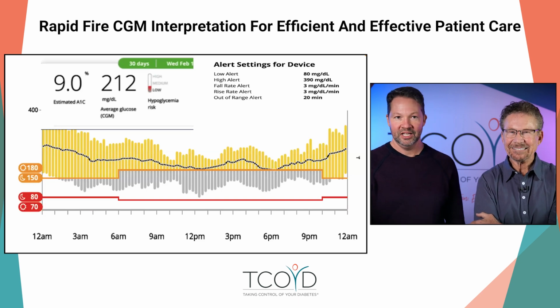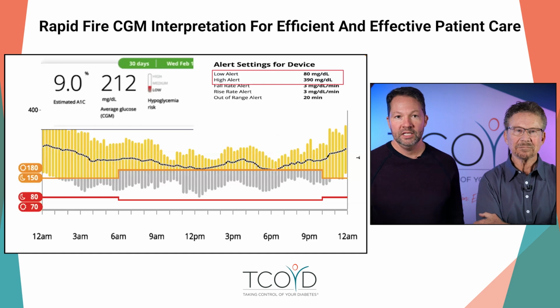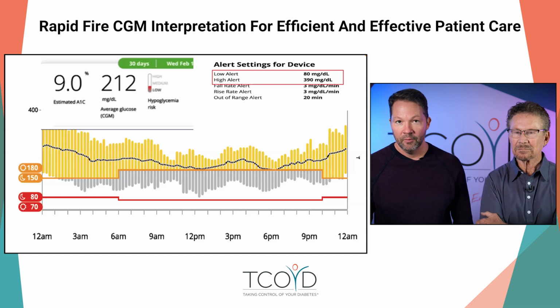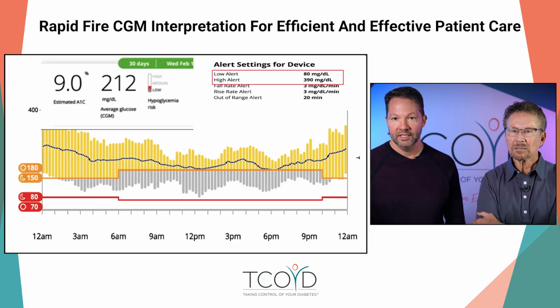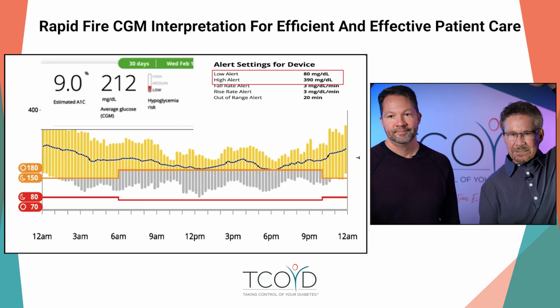Yeah. So here's an example of a patient, and again, this isn't the quiz yet. This is one that I've actually seen. So here's a patient, but just to kind of go through this, what I would see is that their average blood sugar is 212. From there, it estimates that the A1C would be 9%. We don't have their time in range and things like that here, but it would be very low. They essentially have zero hypos, so you don't have to be a rocket scientist to realize that this person's problem is they're high all the time. And the variability is like this much.